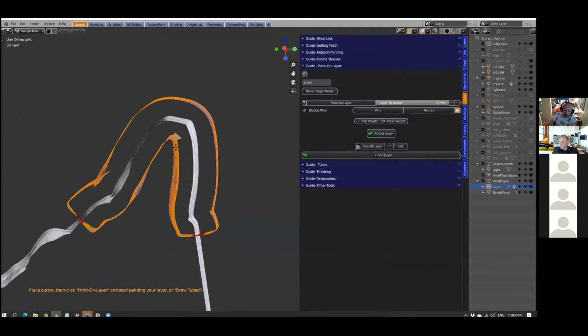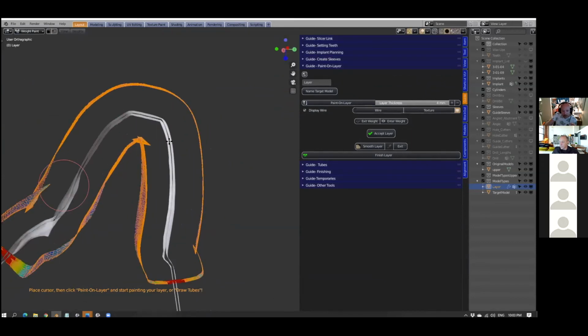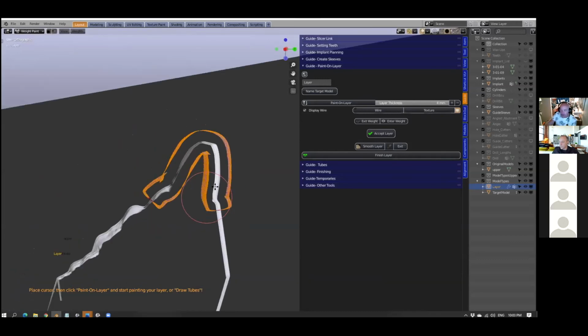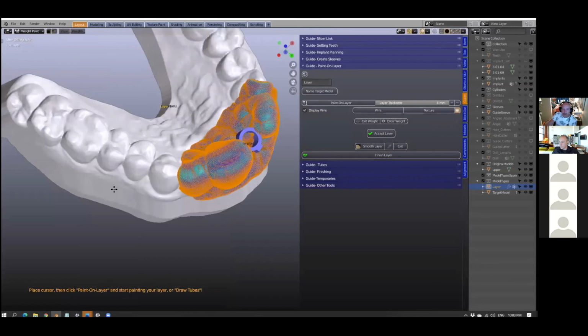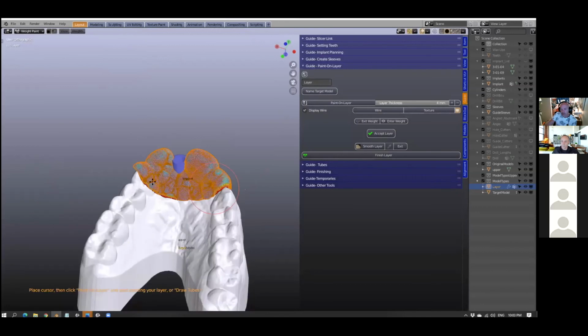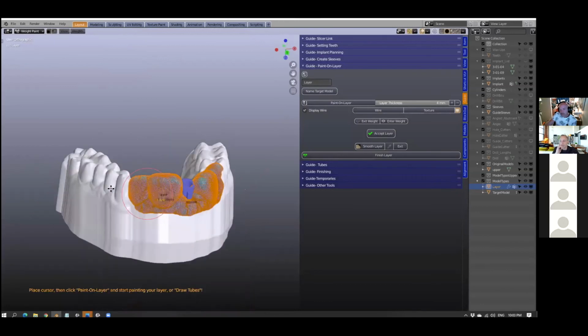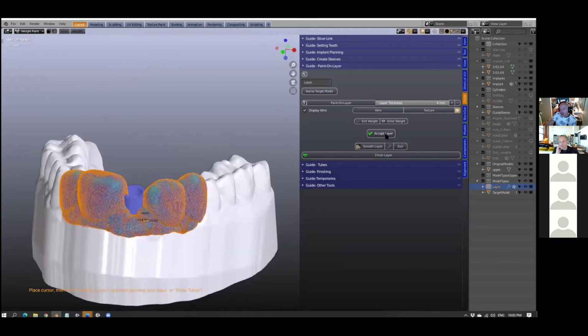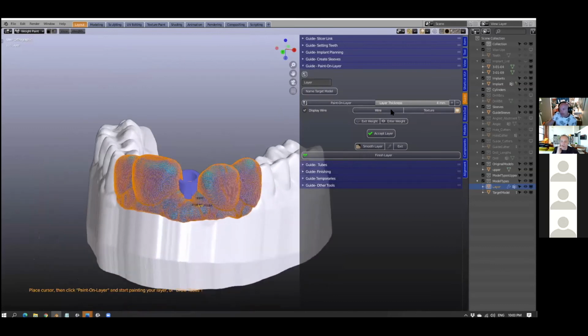And you'll see the mesh is not looking too hot. We've got all this crisscrossing happening here. That's because it's being made solid. So the script then gives a nicer mesh after this. From here on, we're going to accept this layer, so we're going to finish it. Accept layer. Oh, before I go there, we can view this in wireframe. That gives you a good indication of how thick this layer actually is. So it's very helpful as well.